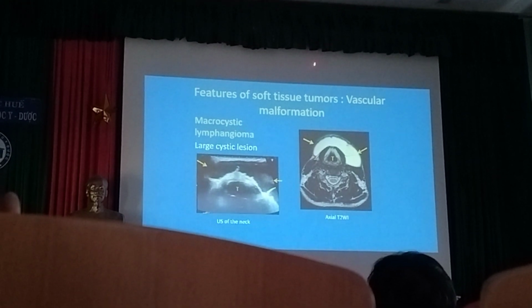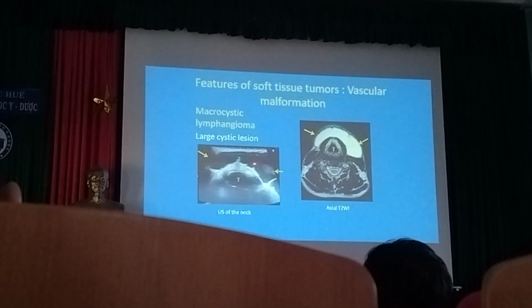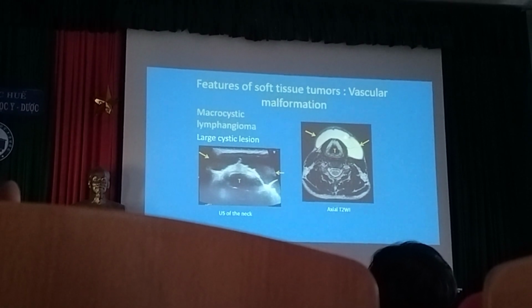Okay. And this another thing is lymphatic malformation. You can see the large cyst on either side corresponding to MRI, and this inside is the fluid.